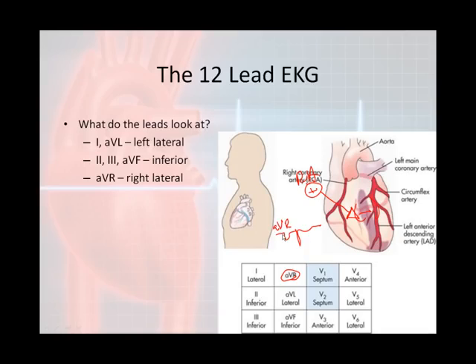If you have a positive deflection in your aVR lead, then you know that the electricity is traveling in the wrong direction. That's about as useful as I want you guys to know for aVR. So let's move on to the interventricular septum.